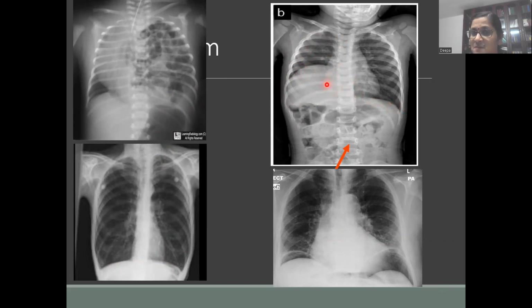If you count the rib spaces, it is 3.5 to 4 spaces above the dome of the left diaphragm. Normally the distance between the right dome and the left dome should never be more than 2 spaces. This is definitely abnormal, and is indicative of eventration of the right dome of the diaphragm. When you see eventration, it could be a birth injury, or sometimes you may have an underlying neurological issue with the baby which has led to eventration of the diaphragm.